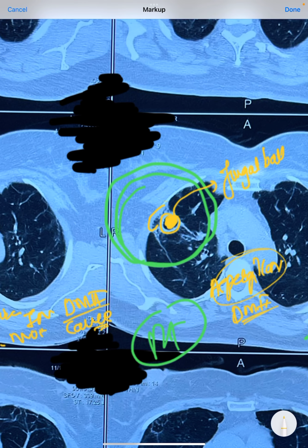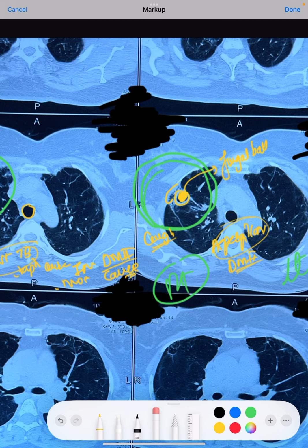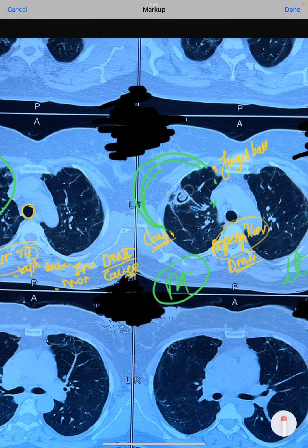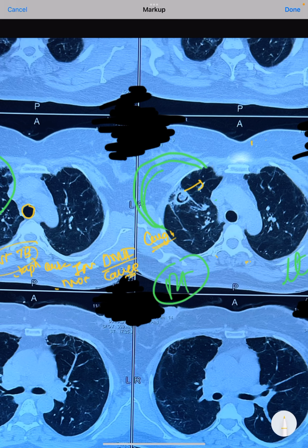Patients can very commonly present with cough, fever, weakness, loss of energy, chills that may last for a month or 2 or 3 as well, and then present to you. Then you do a CT scan and you can find this structure. So this is a typical fibrocavitary lesion with a fungal ball, which is very highly suggestive of aspergilloma. We can simply do the sputum test for aspergillosis.